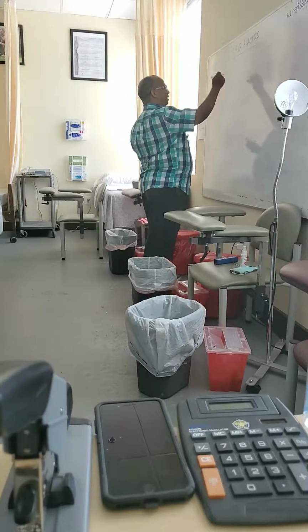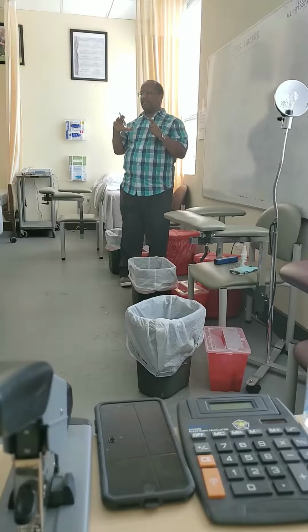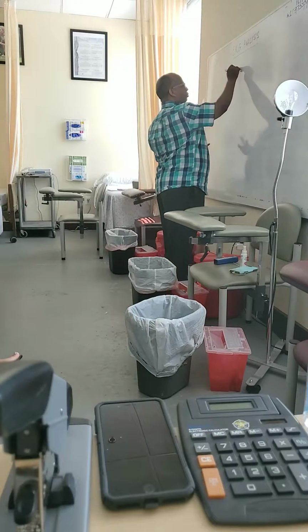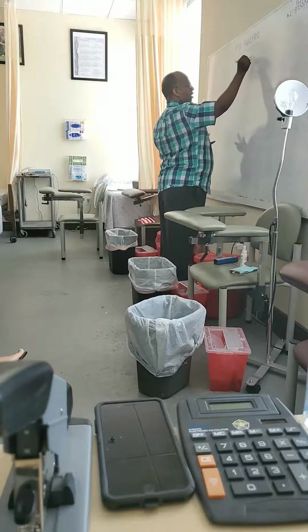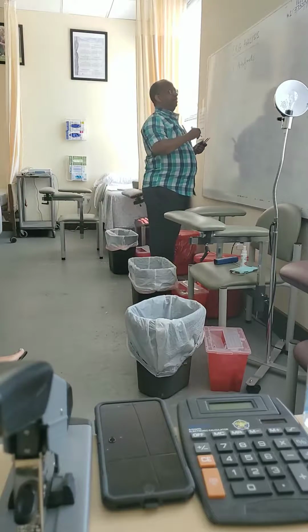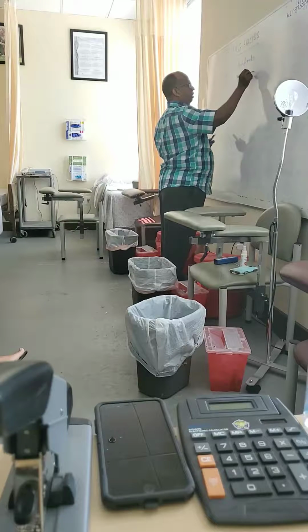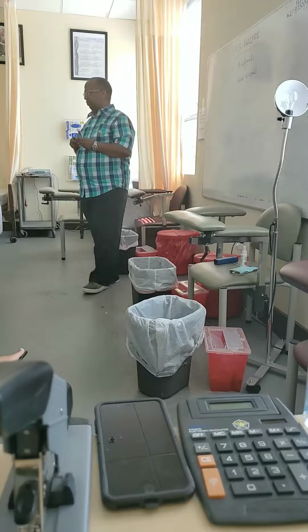One is, you need to check whether your EKG strip is well done or not. How do you check that? One is you have to check for artifacts. And the second thing is you need to check for what is called lead reversal. So we will talk about some important things on this and then we'll pass it.